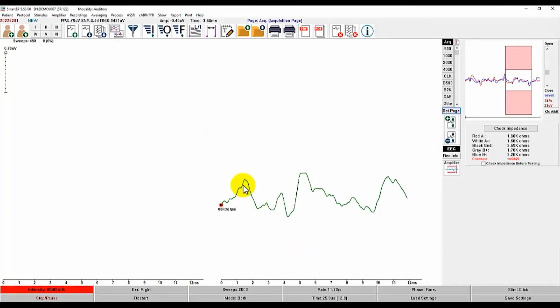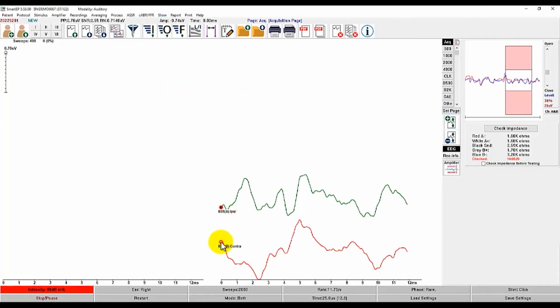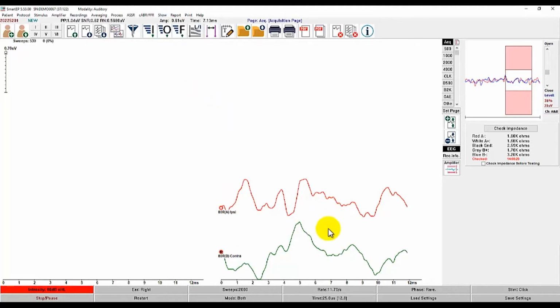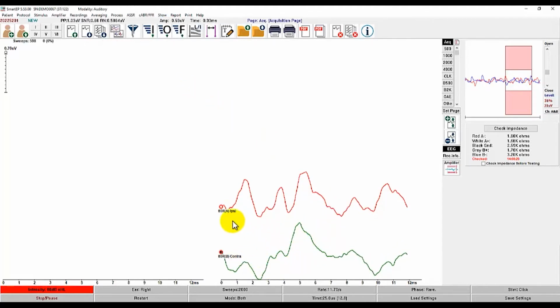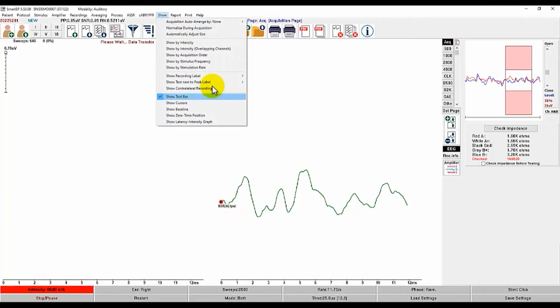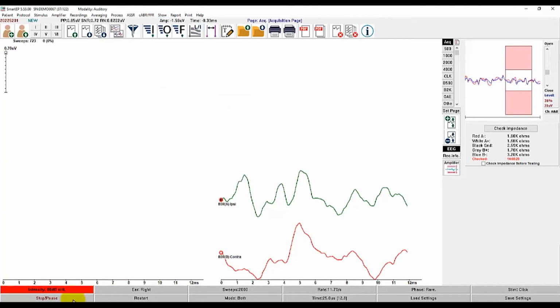If you have the contralateral recording selected, it will not hide the contralateral recording until you click on another recording, as it will not hide an active or selective recording. Basically, if your contra recording is green, it will not hide itself until you select another recording. Now let me show the recordings again, and while we're at it, I will do a fast rate recording in IPSI mode, which will come handy for another feature I'll show you later on.